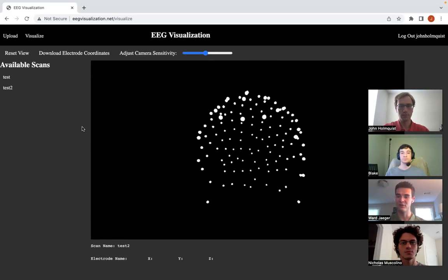So we want to keep those while removing those that have fewer neighbors, which are probably associated with wires or other details inside the scan. Lastly, we perform a DBSCAN clustering algorithm on the remaining points, which will section them into different electrodes. Then the centroids of each of those clusters are rendered here on the screen.